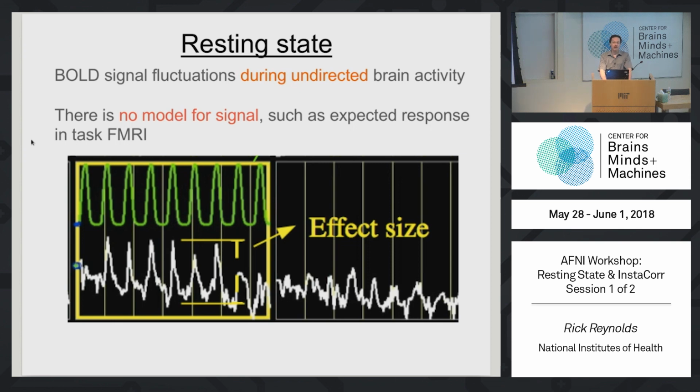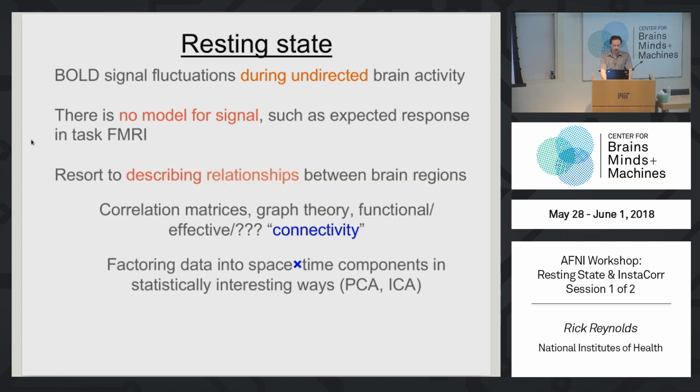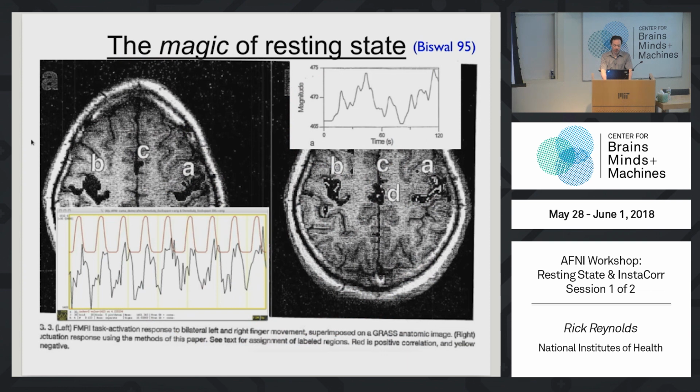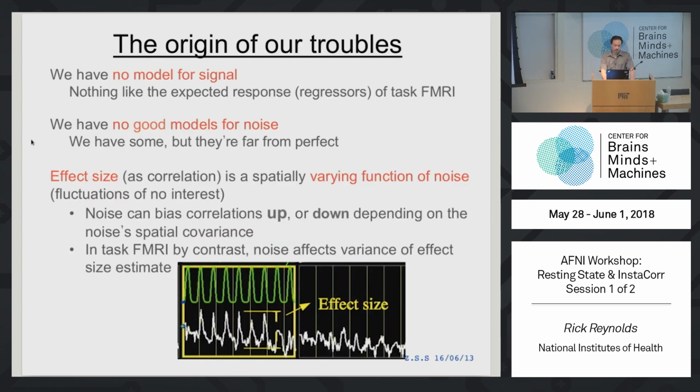So you try to clean it up to some degree and remove what you might consider as likely noise sources, but you can only do so much there. So here's an example of doing resting state analysis on the surface. And note that both AFNI and SUMA can do these, produce these correlation images in the GUIs. It was originally noted by Bharat Biswal in '95, but it didn't take off until many years later.